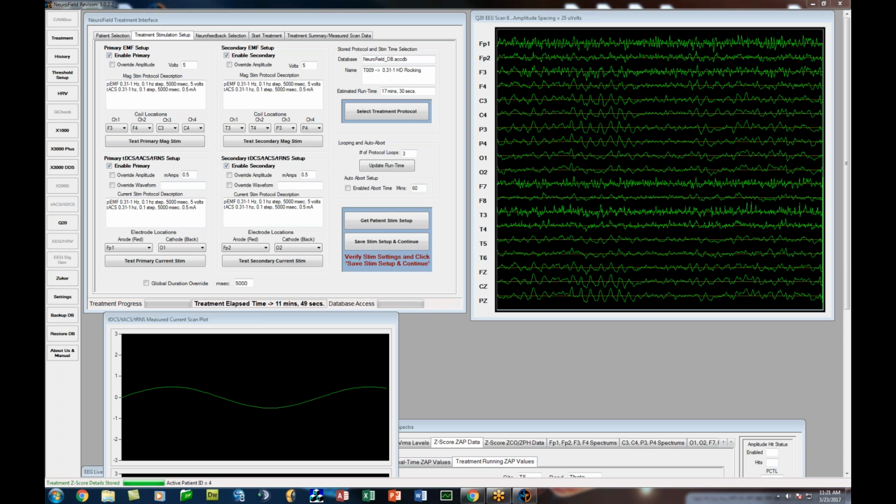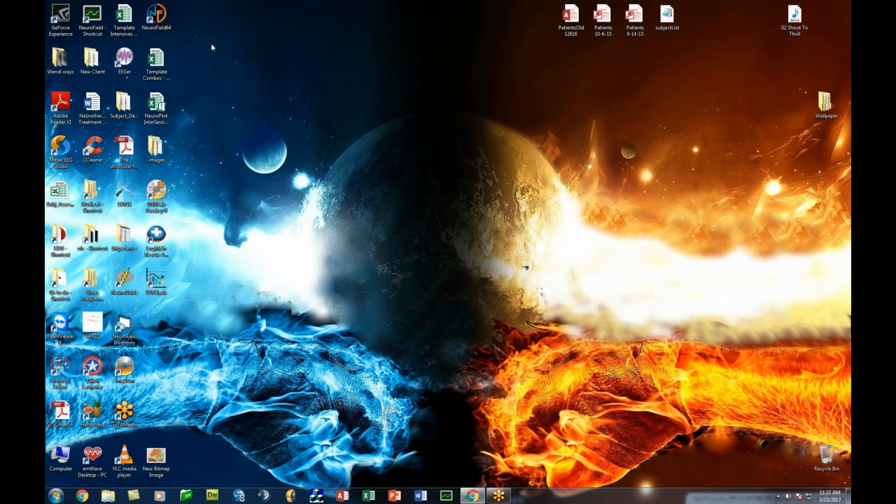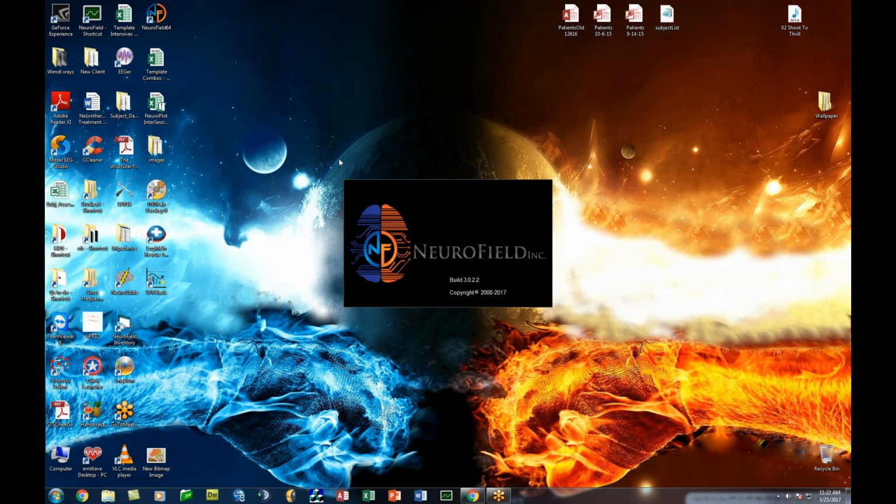All right. If there's no other questions, I'm going to jump into the HRV piece here because, of course, NeuroField has HRV. So now what you're going to see is the other side of the program. So I'm gonna kill this real quick, come back into the program, and we have our HRV unit, and it's all set up.